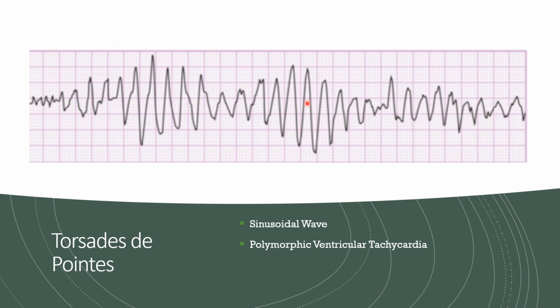And I want you to say, just by looking at it initially, what does it most look like? Well, it looks like ventricular tachycardia, right? You can see what looks like a bunch of PVCs all put together, right? And we learned that more than 3 PVCs in a row is VTAC. Well, that's what this is, except there's one other interesting thing, which is why it's called torsades.